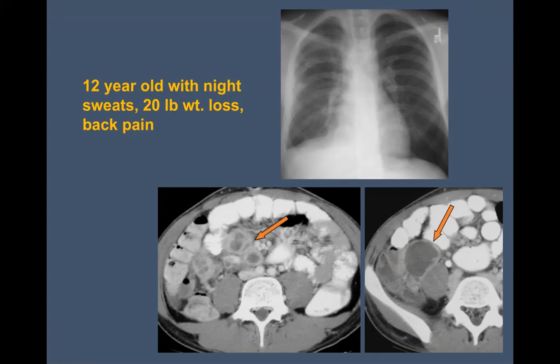So once again, not entirely pathognomonic, but really seldom do we see this much lymphadenopathy related to other types of inflammatory conditions in children, and it almost never has this type of rim enhancement. Certainly you could think of things like a lymphoma as well, but TB would be a good bet for this combination of findings in children.